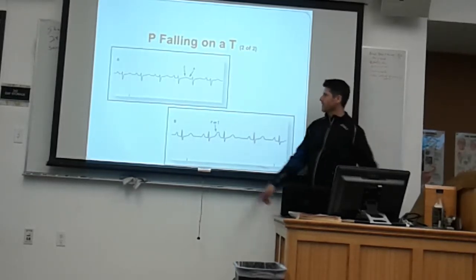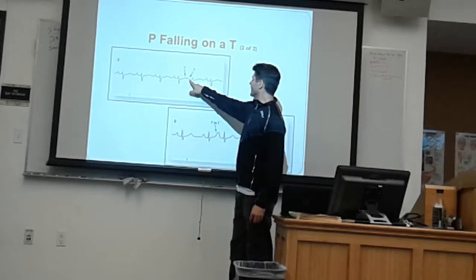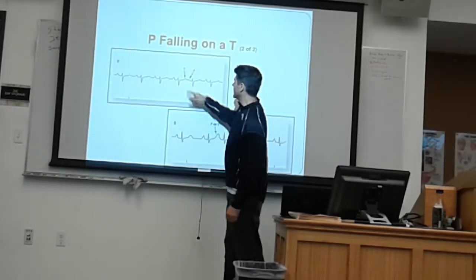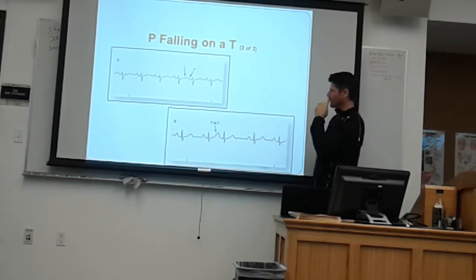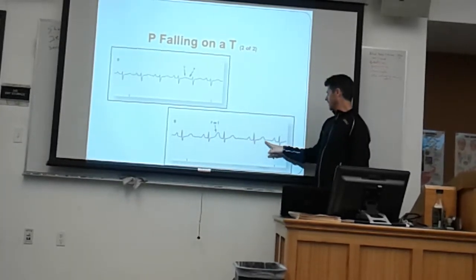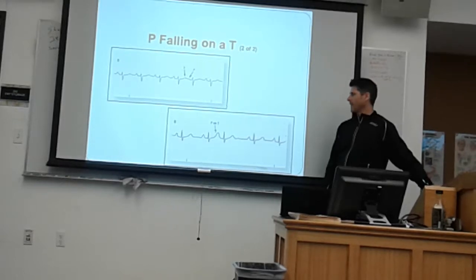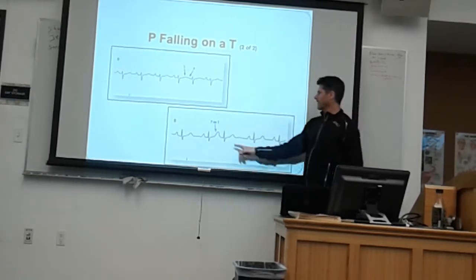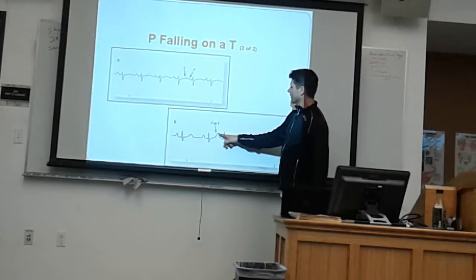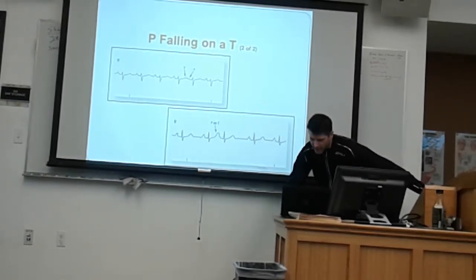And it can look any number of different ways, right? So here we've got a P wave coming in. This is where the P wave is supposed to be, right? That's our P wave. This one's different, and that P wave looks different, and it's tucked right up against that T wave. I should have had some space there, and I don't. So that P wave is tucked into that T wave. Or here we have T waves that are supposed to look like this, with this amplitude, and note that this T wave has a much higher amplitude. That makes me start to think about whether or not there's a P wave tucked in there. And I've got a conducted QRS that looks exactly the same. Wow, okay. I've got a PAC sitting there. In this case, a conducted PAC. Make sense? Questions on that at all?